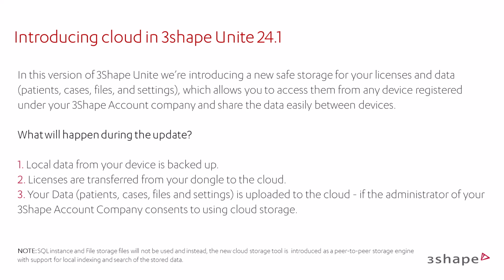This feature allows you to access them from any device registered under your 3Shape account company and facilitates easy data sharing between devices. During the update process, local data from your device will be backed up. Licenses will be transferred from your dongle to the cloud. Your data, patients, cases, files, and settings will be uploaded to the cloud, provided the administrator of your 3Shape account company consents to using cloud storage.